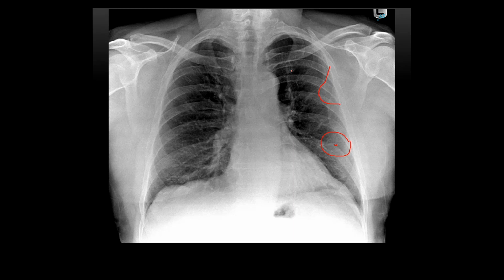Low dose because this patient had only the chest X-rays, so it could be just a benign lipoma as well. You can have pleural lipomas, which have this characteristic appearance on CT scan because on the lung windows you can see them, but as soon as you change it to the standard windows, they vanish. So it's a good test to do first to see whether it's a pleural lipoma or not. Right. And that's it. That's all I have for you.